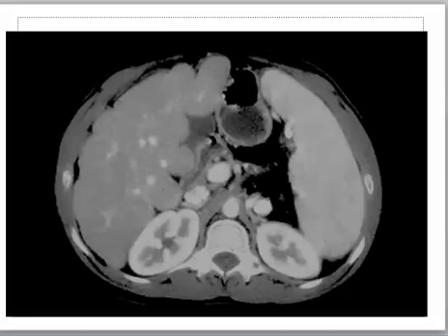And somebody can ask me why you can say that this is enlarged. Simply because it is cutting more than 3 rib distance.